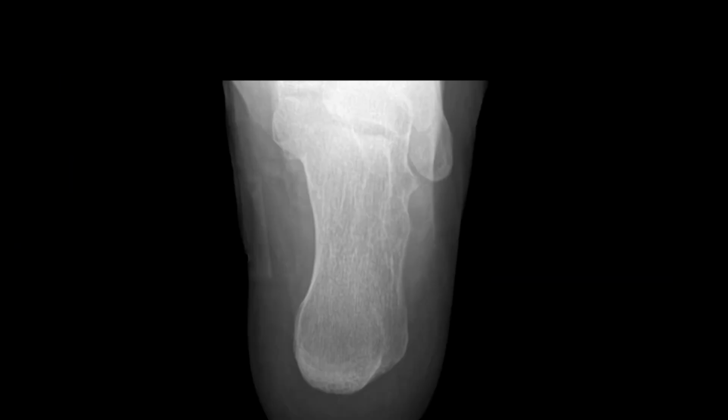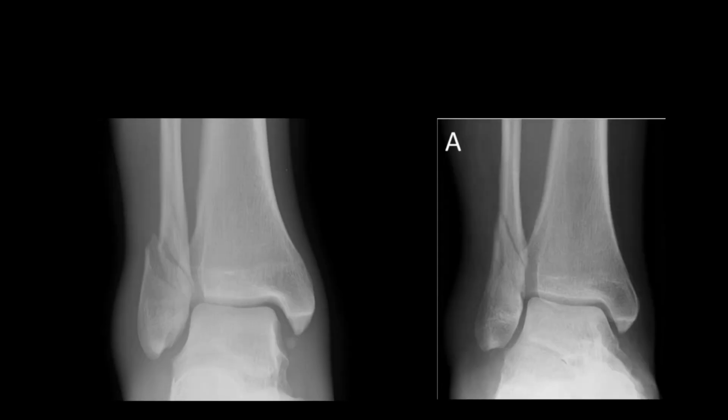Moving on, we have the calcaneal view. Again, this can be used when we're suspecting a calcaneal fracture and we can't see anything as clearly in the lateral or mortise views. Again, the main thing to trace over here will be your calcaneus, which we can see over here. So moving on to our pathological fractures, these are two different x-rays to point out.